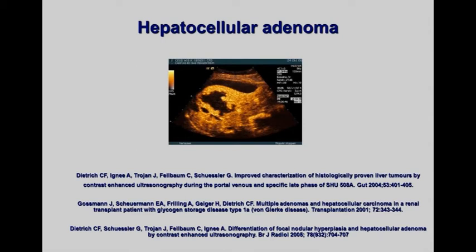Just to repeat, hypoenhancement in the portal venous sinusoidal late phase means suspicion of malignant infiltration. But we also have benign lesions which might show hypoenhancement in the late phase because they have no or less liver-specific vascularity, portal vein branches. We talk about hepatocellular adenoma.